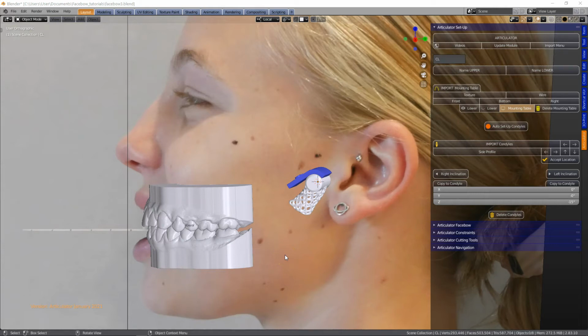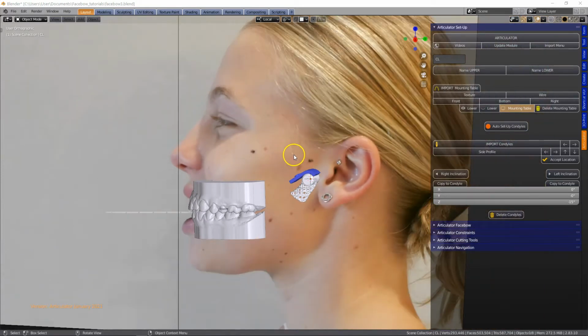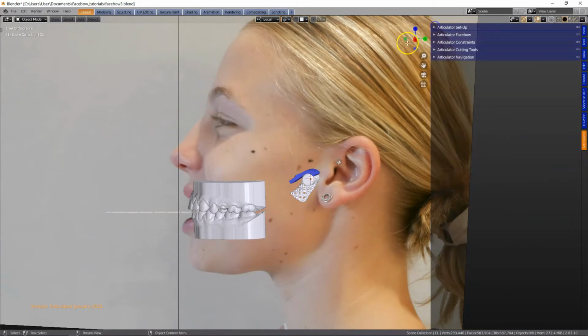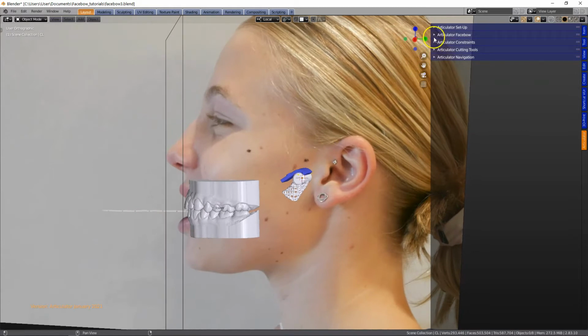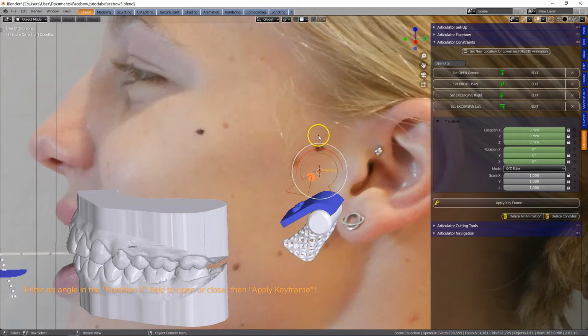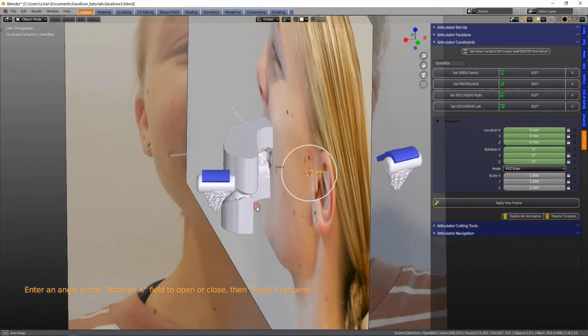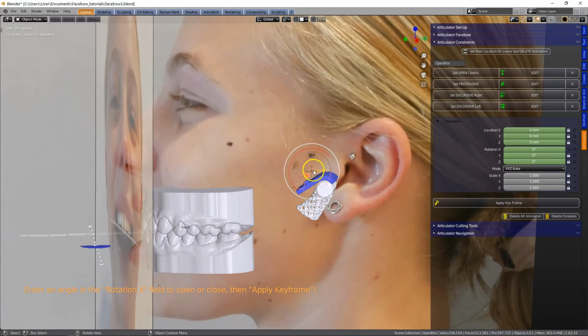This is a continuation video of the tutorial video in the Articulator module. So we have finished placing the condyles according to facial photographs, and I would like to animate this specific lower jaw. So what we're going to do is open up the constraints and set open centric. This will place an arrow in the center of the workspace. Now the condyle is going to pivot along this arrow.